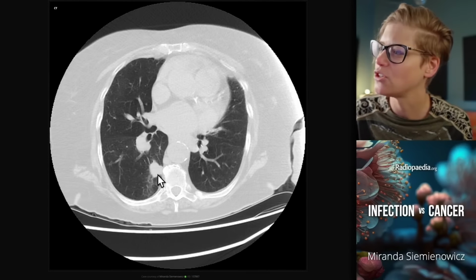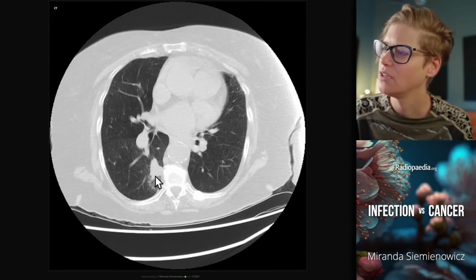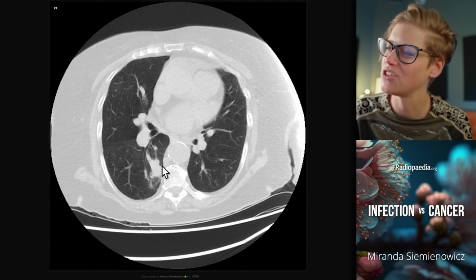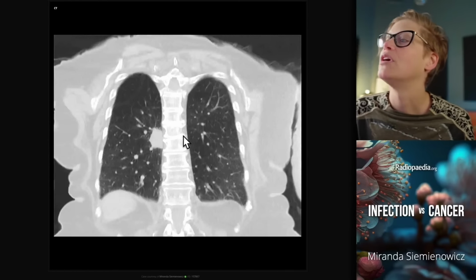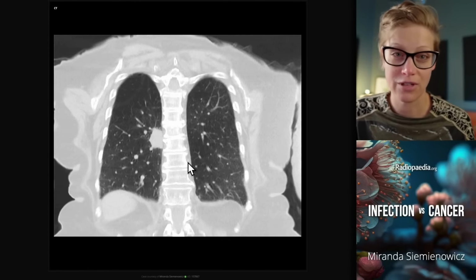We've got these large lobulations, and when we scroll up and down through the lesion, do we have a straight margin here? Do we have a straight margin here? Is this an angulated margin, or is this a lobulation? Well, you'd never look at a fracture in just one projection. Let's have a look at the coronal, and now you see an absolutely beautiful polygonal outline.